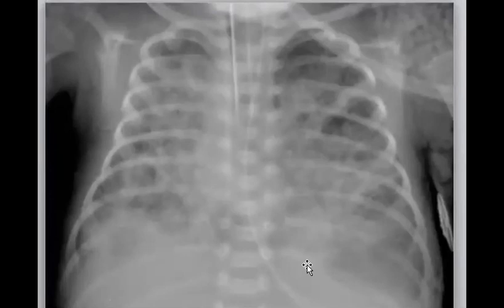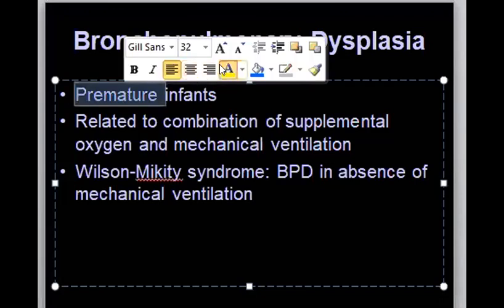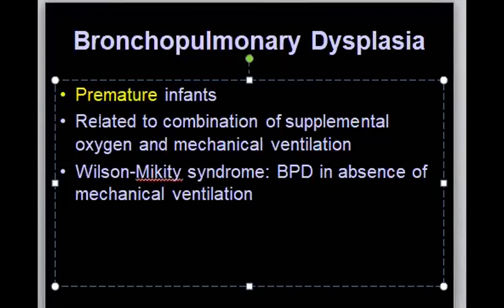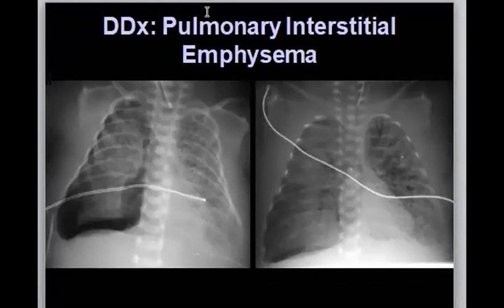Perfect. So you now have two differentials. Either bronchopulmonary dysplasia, which again is the most common complication of prematurity after mechanical ventilation and oxygen, or the other differential, which will be congenital pulmonary interstitial emphysema, when you find many lucencies.